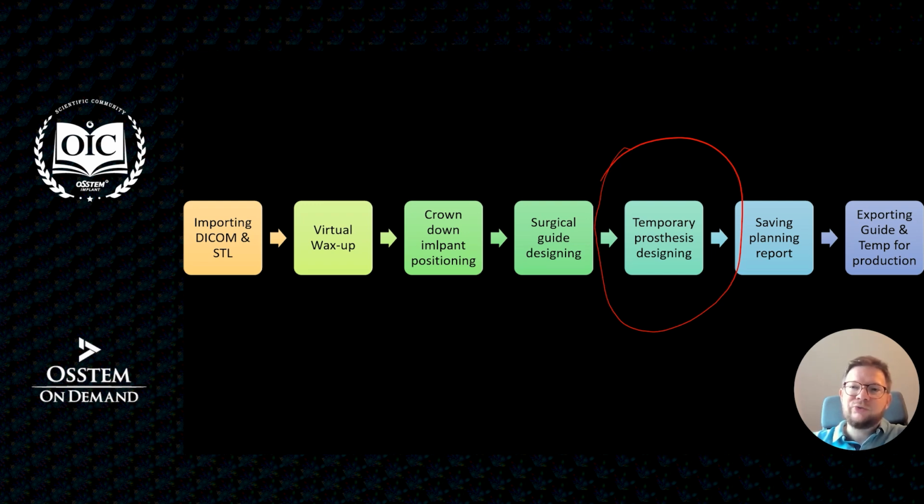work during or at the laboratory part of the workflow, because this part is the clinical part, so this whole workflow is clinical workflow. And after having these parts exported, then we can go to dealing with the lab. However, in the meantime, there is also the healing time after the surgery and another registration of the position of implants with scanners or classic impressions.